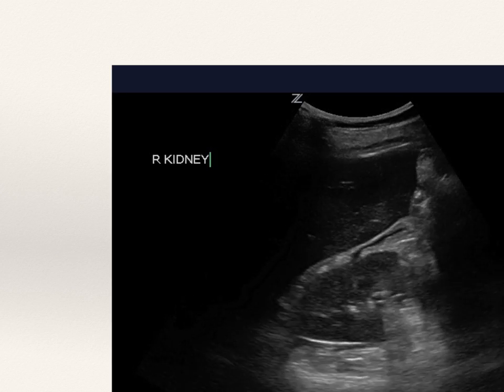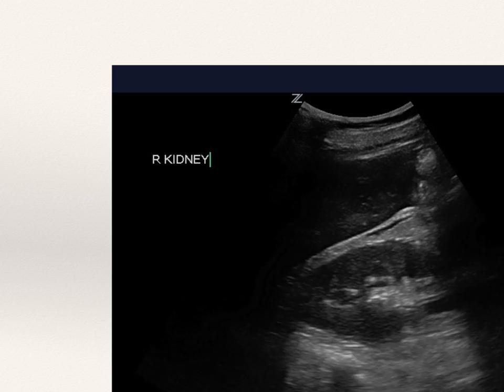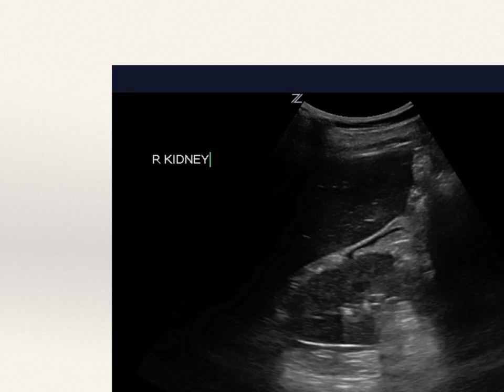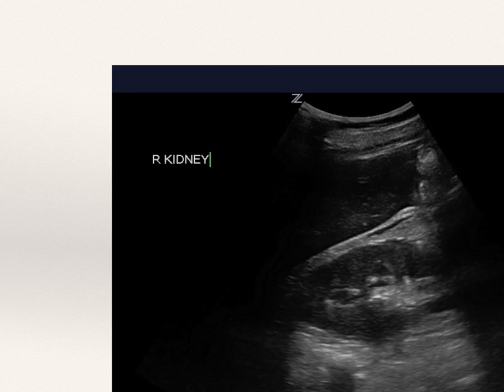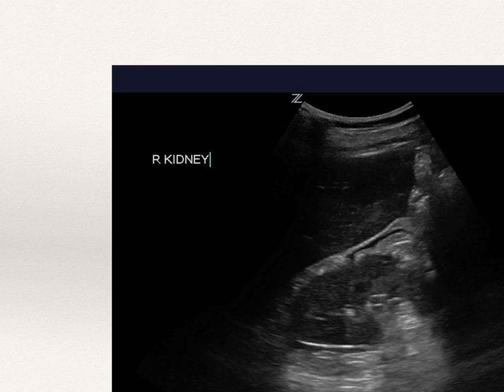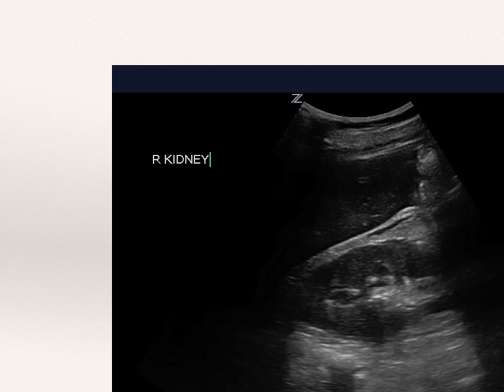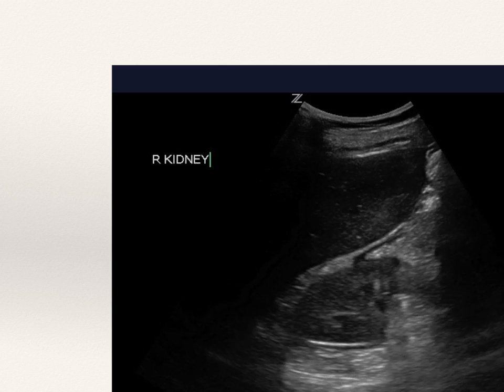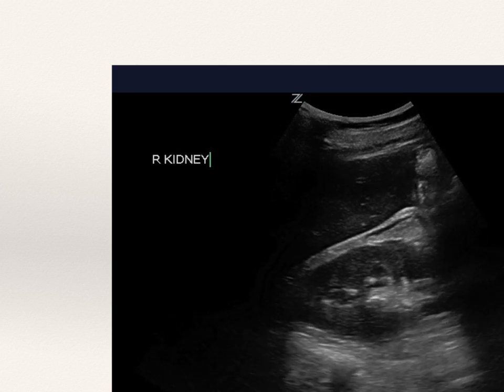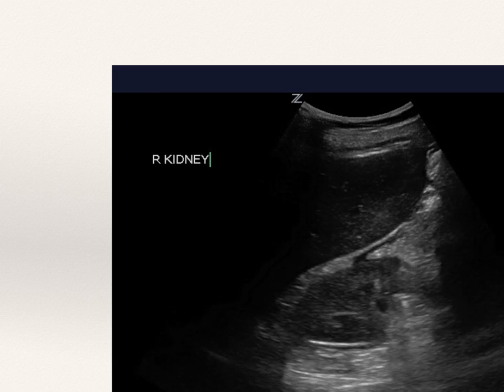Now, positive FAST, yes or no? And why? So if I'm asking if there's a FAST, it means there must be fluid here somewhere. Does everybody see?